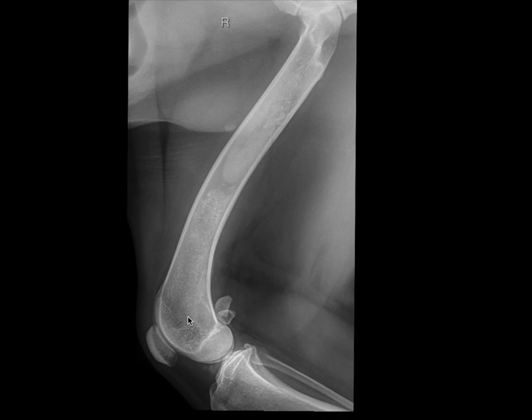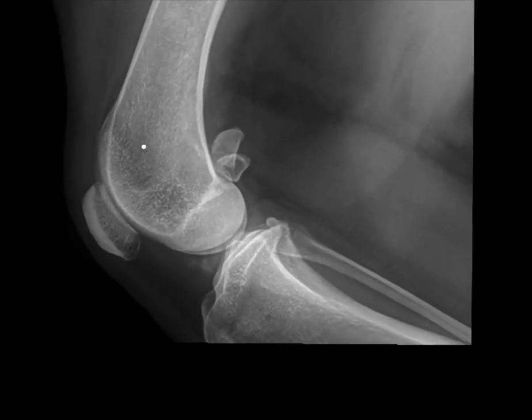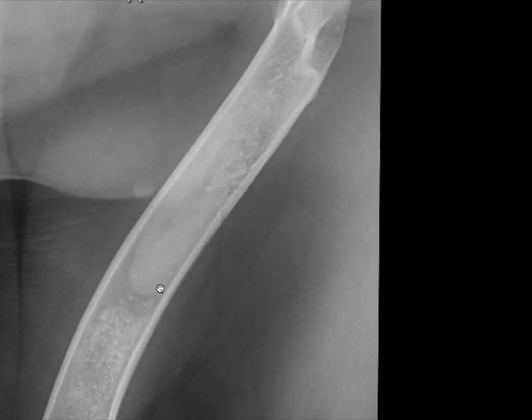If you look at the distal femur, you can see that the normal trabecular pattern is an interdigitation of mineral density, mineral opacity, as well as sort of a fat opacity. If we look at the more affected part of the femur, you can see that the opacity is quite uniform. I also like to look at the periosteal and endosteal surfaces, meaning the outer and inner aspects of the cortex, and you can see in this particular case that they're smooth.